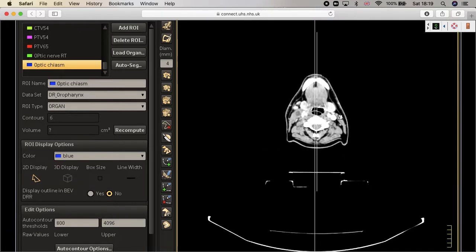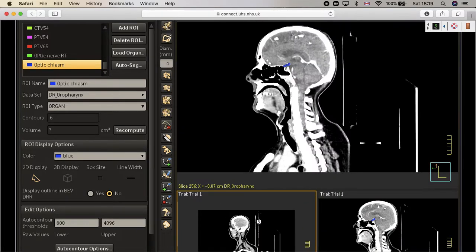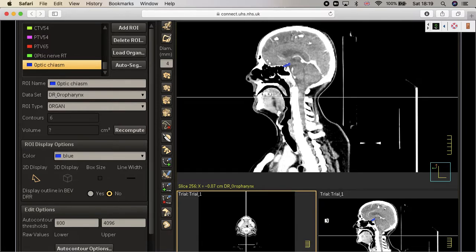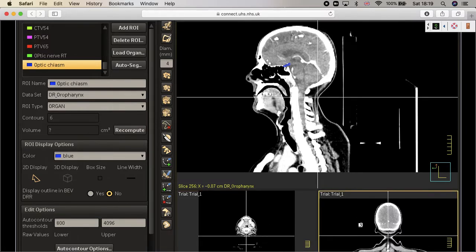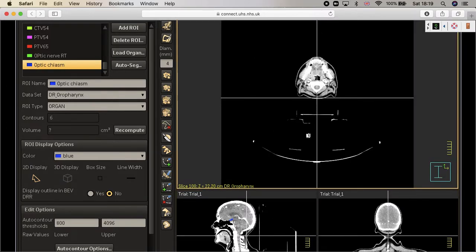And the second structure I want you to be aware of is what we are calling it the... let's say here, this should be axial, this should be maybe coronal, or maybe this is sagittal, and this we make it axial. Okay, the second structure I want you to do is the hypothalamus. Sorry, it's not the hippocampus, I'm talking about the hypothalamus. Are you going to draw the hypothalamus on the CT scan? It seems you are a crazy guy.